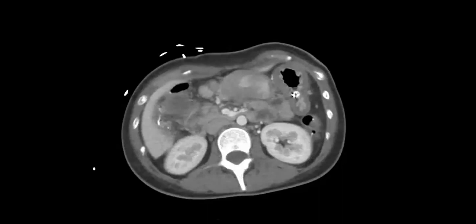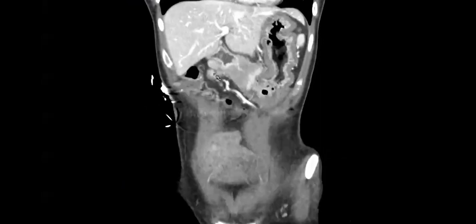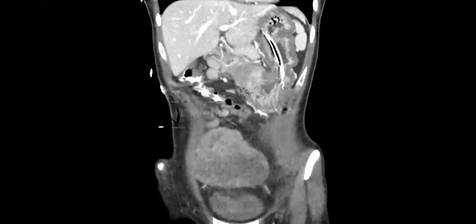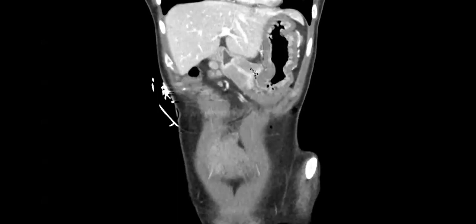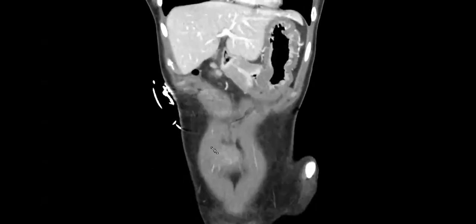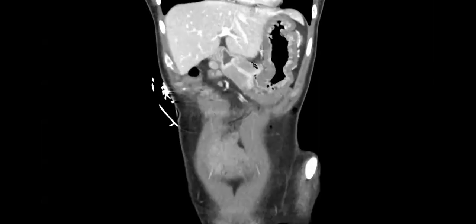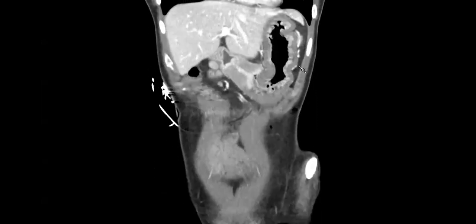So the take home point is when you see Krukenbergs or possible Krukenberg, look at your stomach carefully. Don't just blow off something as a pylorus, look for adjacent lymph nodes. And gastric cancers can grow. Actually Rupa showed a case of this a few weeks ago where the biopsies all looked smooth, but they had to go deeper into the submucosa to actually get the diagnosis. So even if the endoscopy is smooth or the pathology says negative, you should stick to your guns and tell them to rebiopsy.